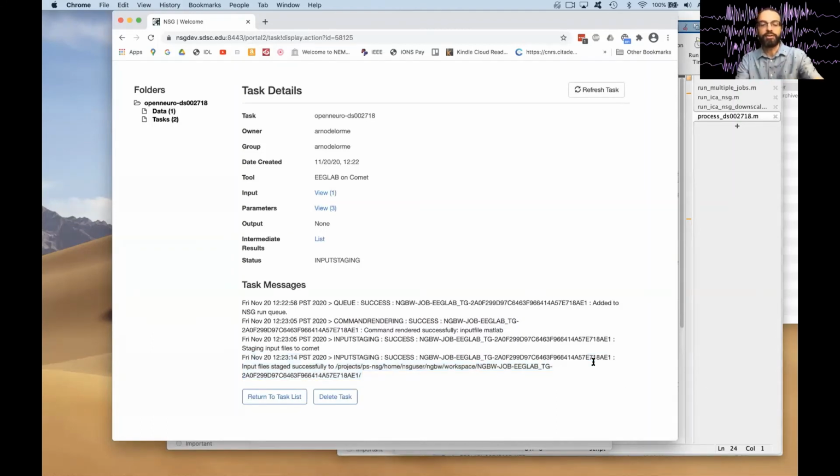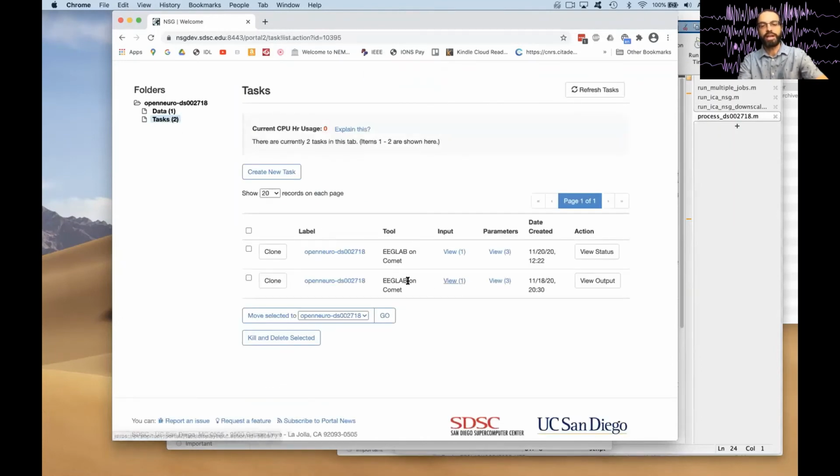And I don't know if you'll be able to see that. Even when it's still in the queue, it gets added. But it takes sometimes up to 1 minute to do that. It's not instantaneous. So let's assume the job is done, and we'll come back at the end to see if actually this job is done.